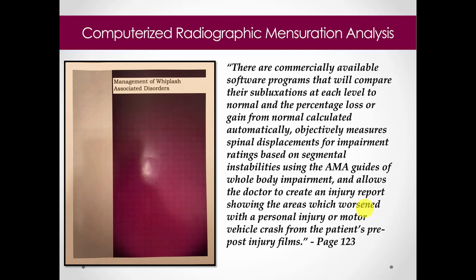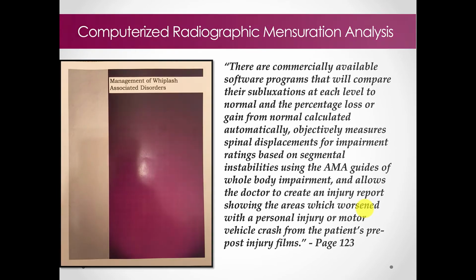Now, my advice to you is, if you take X-rays on a patient, you should do this across the board, on everybody, is my personal opinion. Because many patients have had traumas in their past, they just forget about them. So you should be measuring everything. If not with this system, you should be measuring in your PACS system. Or if you're still somehow using plain film, measuring by hand.